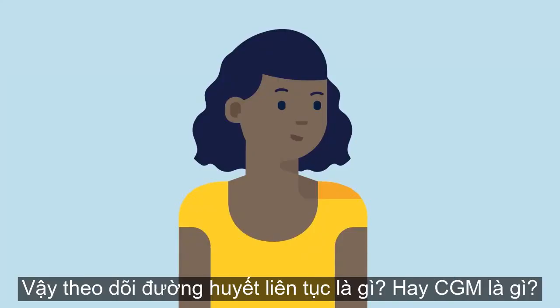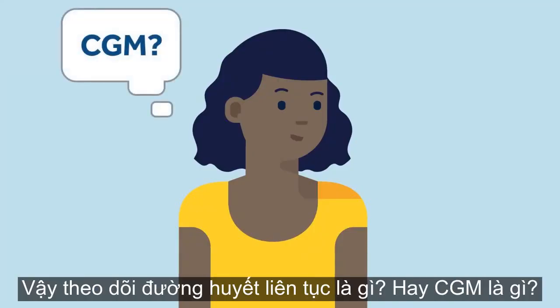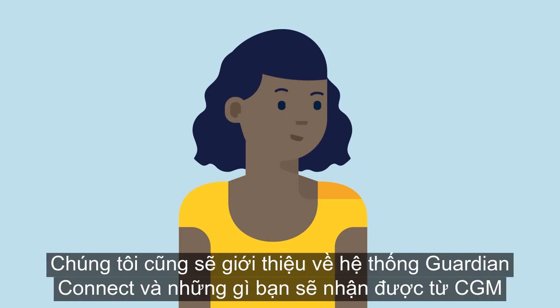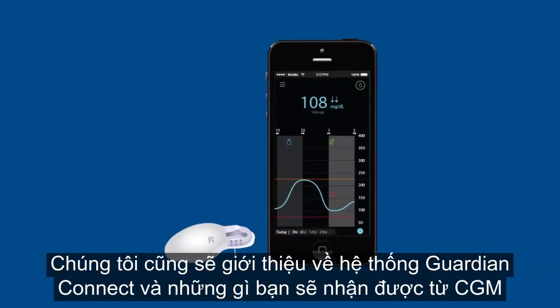You may be wondering, what is continuous glucose monitoring, or CGM? In the next couple of minutes, we will explain what CGM is and what it can do for you. We will also introduce you to the various parts of the Guardian Connect system and let you know what you can expect when using CGM.